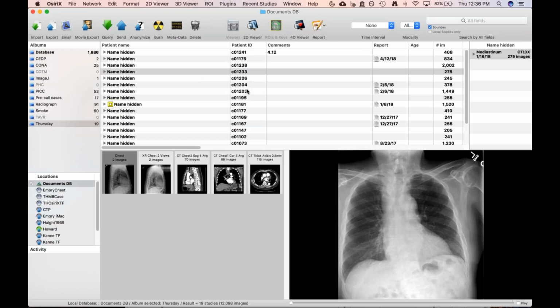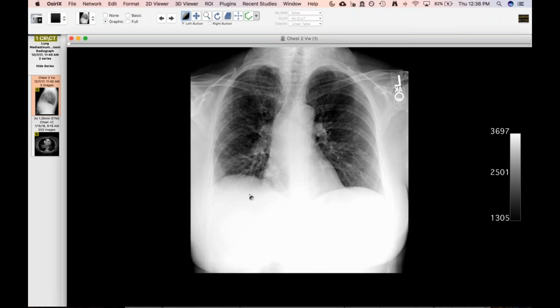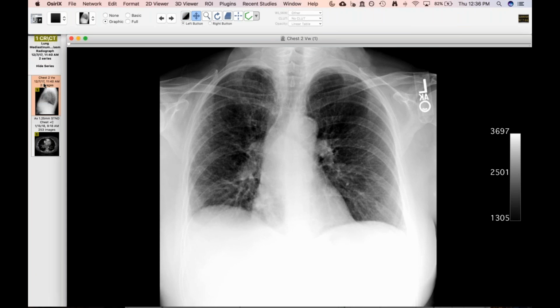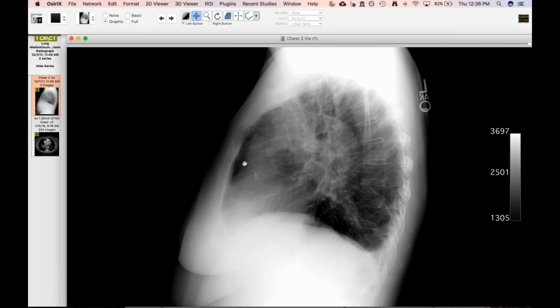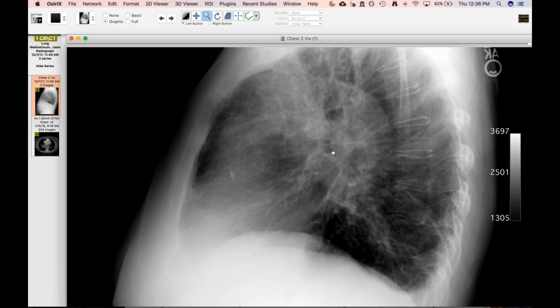And then one more subtle radiograph. This is kind of an interesting one. This was a patient who was presumptively diagnosed with pneumonia. I think this was done either in our ED or somewhere, but whoever read this just saw that there was some asymmetric opacity in the right upper lobe. It was, you know, back in December, flu season. Thought maybe this patient had a pneumonia. There's a few issues with that, and no comment was made on the lateral view, but I think we can all recognize a few things here.